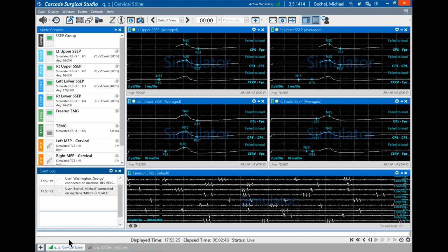So if you weren't able to connect for some reason, it doesn't stop you in any way from recording your information. You gather the data. The next time you are plugged in and synchronize, it will automatically do that for you. Nothing to worry about there.